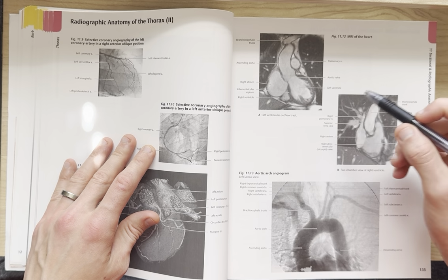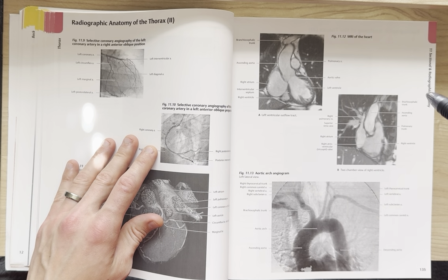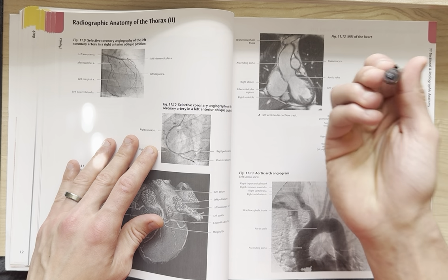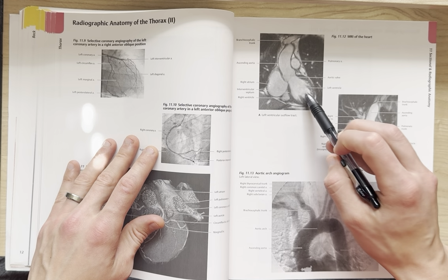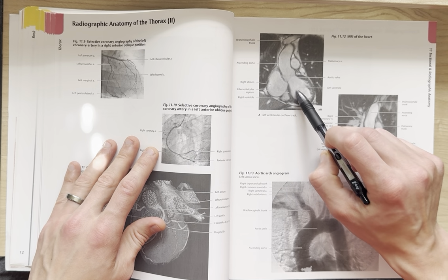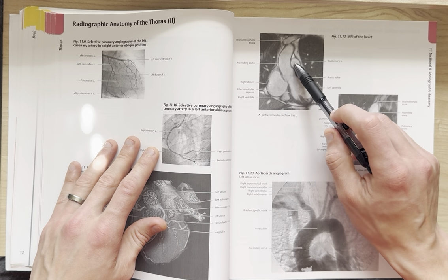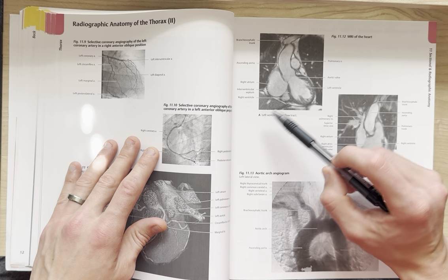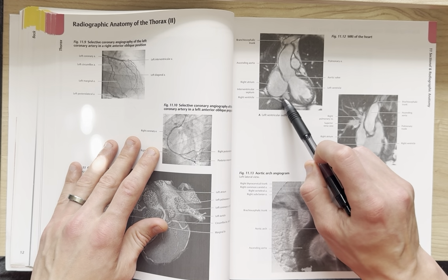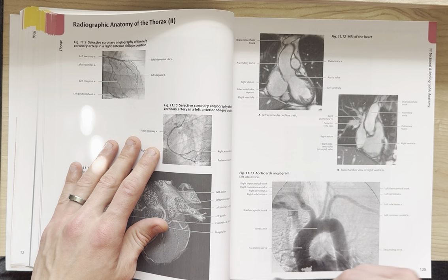Here's an MRI of the heart, and this says left ventricular outflow. So we're going to be looking down into the left ventricle and what's coming out of it, or what it's feeding into. So here's the left ventricle, and then coming up out, going into the ascending aorta. Here's your brachiocephalic trunk. Here's your pulmonary artery in the general area. Here's your right atrium, which means that just barely visible is your right ventricle. And there's that thick interventricular septum.